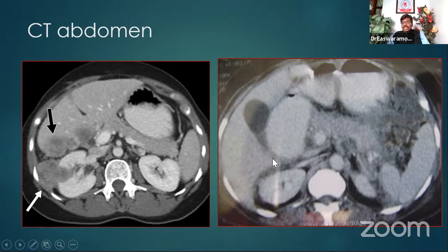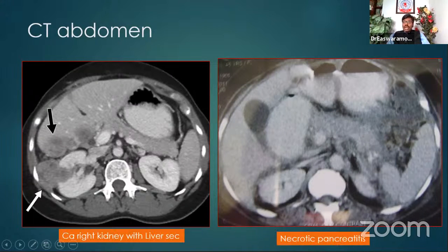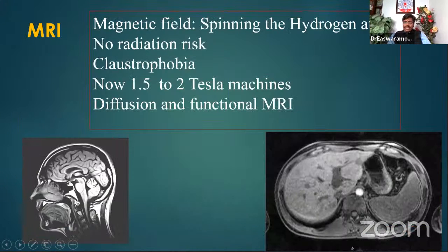Okay. And here is another patient with another pathology. You can see a pancreas very grossly swollen, acute pancreatitis. So like that you can have a diagnosis with a click of the button.